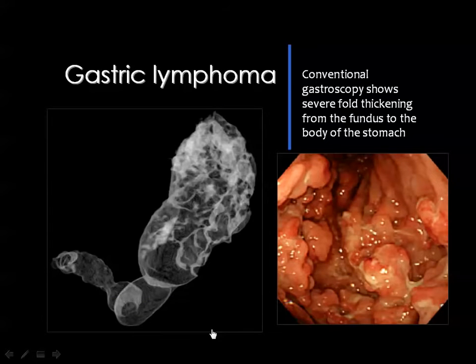And this is also one of the ways you can have it by CT, which is known as CT virtual endoscopy. You have the ability to scan the upper abdomen, then you tell the CT to remove every structure, leaving only the stomach. Then you can reconstruct the stomach the way you like, in the axial image, in the coronal image, in the sagittal image, and you get an appearance like this, which is almost similar to that obtained by barium.